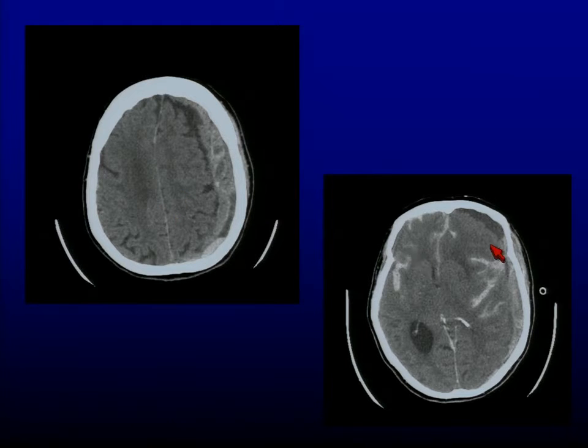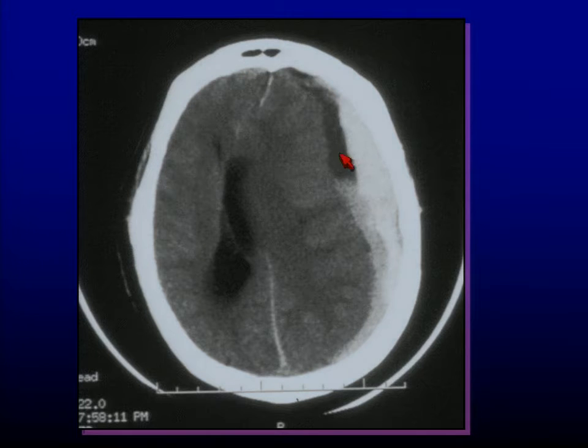unconscious. Here's some more acute subdural with subarachnoid hemorrhage associated with it. And then an acute on top of a chronic subdural. Here's a classic look of a chronic subdural. You know the patient survived this one because it's more than a week out. It's been digested. As they lay on their back, it's called the hematocrit effect. You can see their crit is a lot, like 46, 50. And this is all sera, that's all cells.